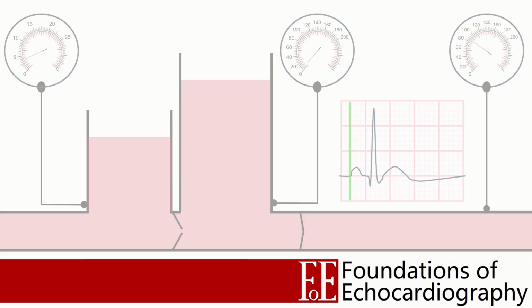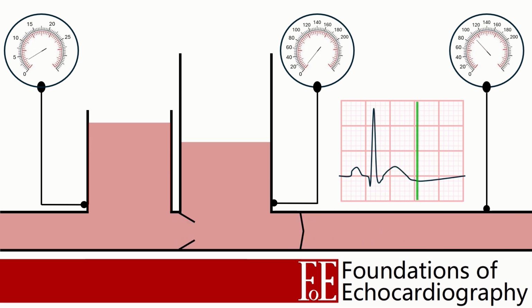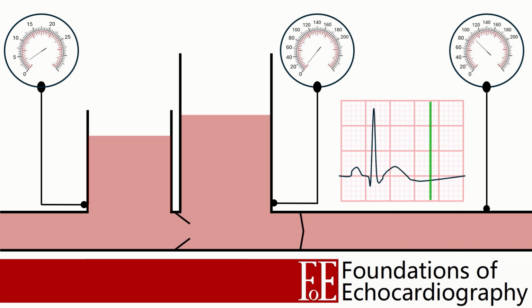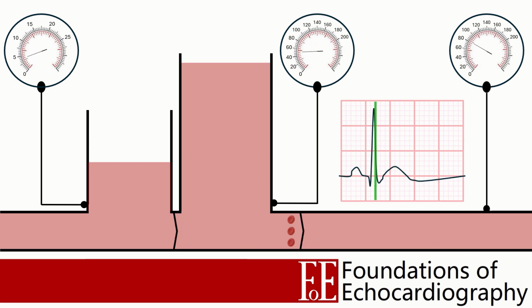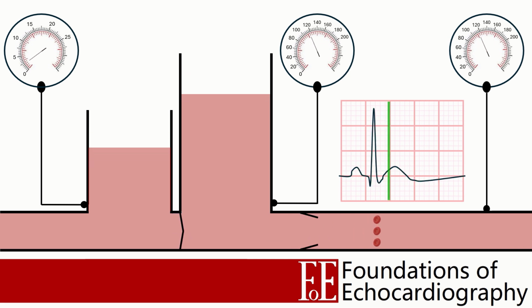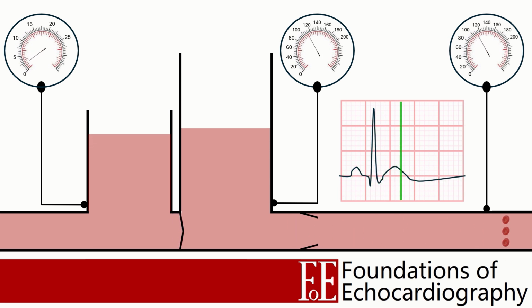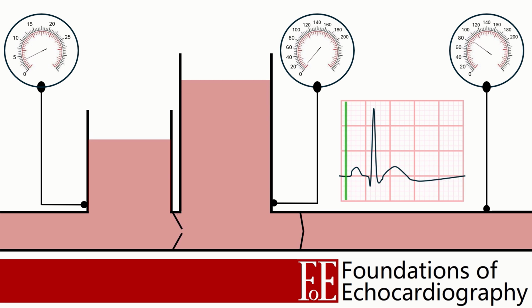An extremely common pathology that you will encounter time and again when performing echocardiograms is aortic stenosis. We have seen how the blood has to accelerate as it passes through a narrowing, and exactly the same thing happens when the aortic valve is stenotic. The greater the severity of the stenosis, the smaller the hole the blood has to pass through, the faster it must travel. Now we're looking for the fastest measured velocity. We are not concerned with exactly where the velocity arises from, but it's essential that we don't miss it, and the velocity might well exceed 5 meters per second, so far beyond the Nyquist limit using pulsed wave Doppler. And so now we're going to be using continuous wave.